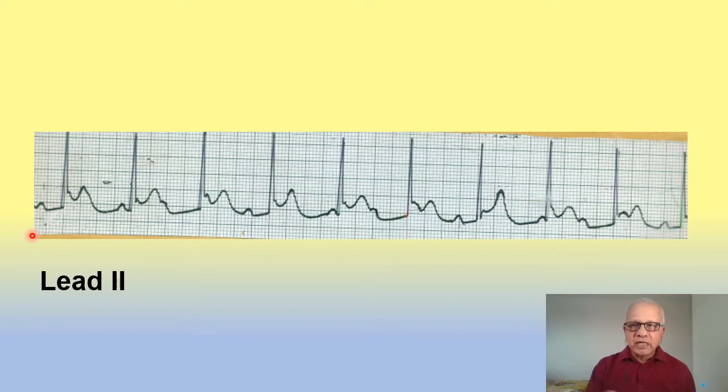Except these two, it is seen in all the leads. So it doesn't conform to a lateral wall, inferior wall, anterior wall like that as in myocardial infarction. So we call it a global ECG change which affects all the territories, right? So that is the classical finding in acute pericarditis. Read about it somewhere. Okay.